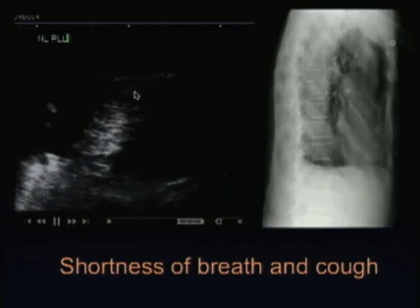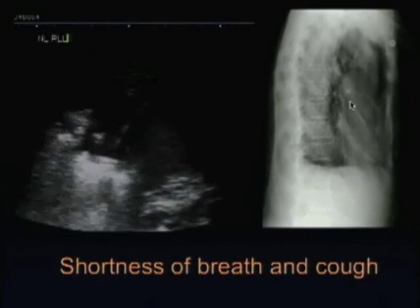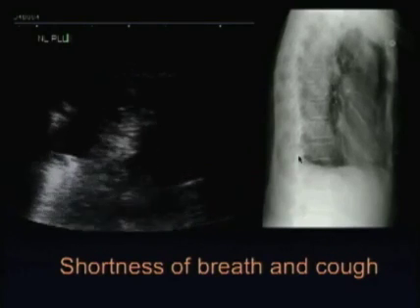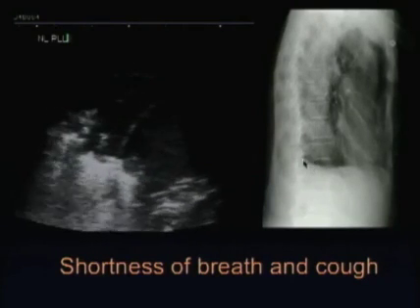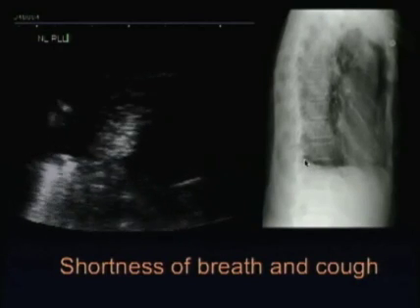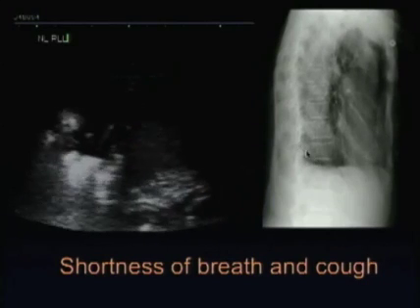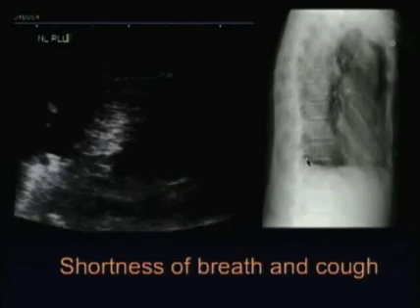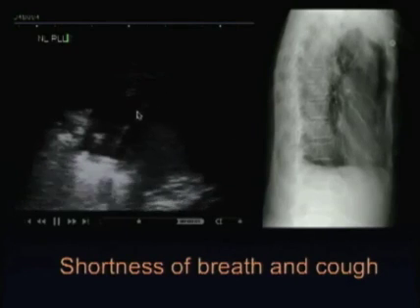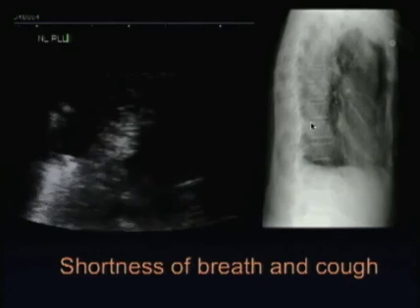A chest x-ray had been ordered and returned with this lateral view here. It was initially read as negative by the radiologist, but I think there's unquestionably an area of consolidation back here, which on the chest x-ray could be confused with a posterior costophrenic effusion, although I think a slightly irregular margin here might argue against that. Anyway, it's clearly seen here to be a consolidation right down in the costophrenic sulcus.